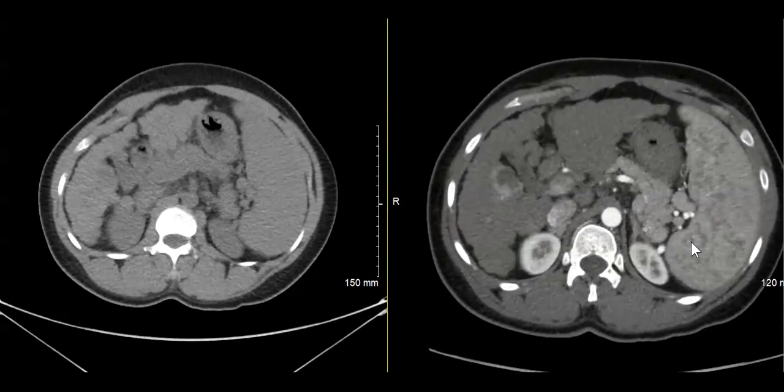So this is one of those very aggressive, proliferative subtypes of HCC. Patients with HCCs which meet criteria for LR-M and have solitary rim arterial phase hyperenhancement, controlling for everything else, do worse than HCCs which fall into the LR-4, LR-5 category.